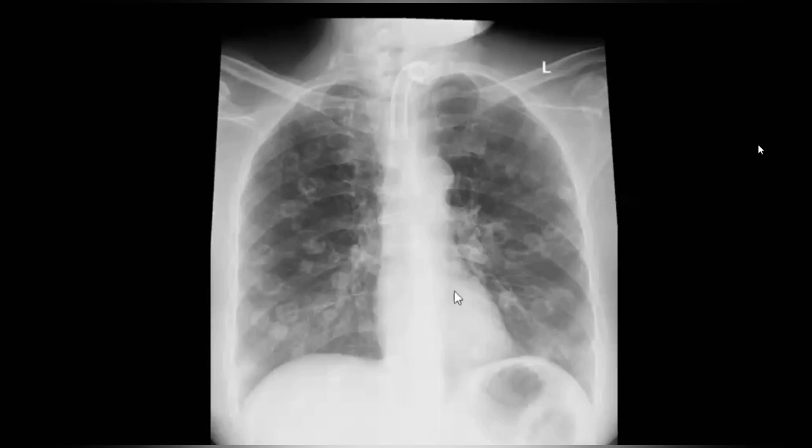The stripe is clear, so there's at least no major consolidation there, right? Yep. There is no pleural effusion and no retrocardiac density. The diaphragmatic contours appear normal, and the visualized bones appear unremarkable to me.